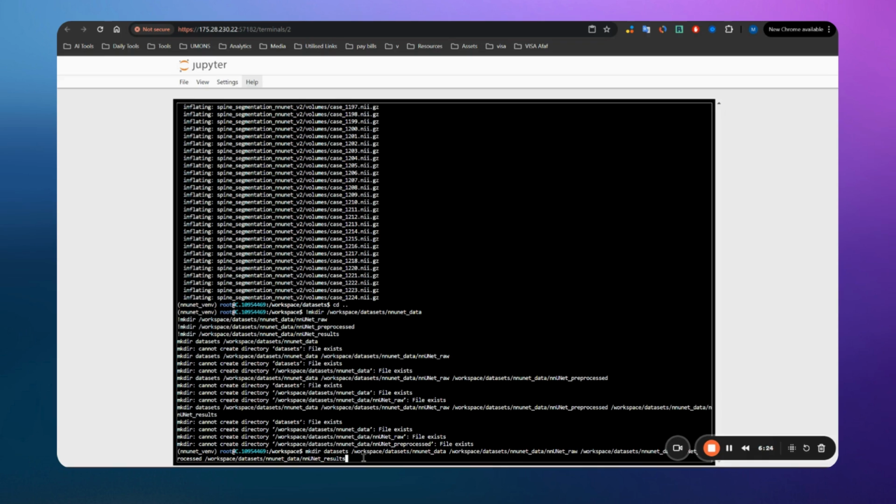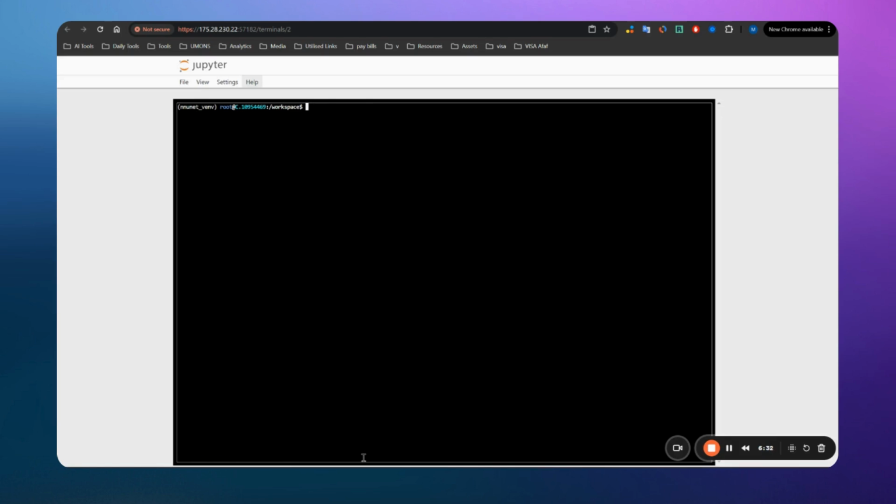As you can see, I am trying to make the video as spontaneous as possible, so that if I make some mistakes in the code or in the process, this will be helpful for all of us, so that we can understand why some things are not working and we can correct them in real time.